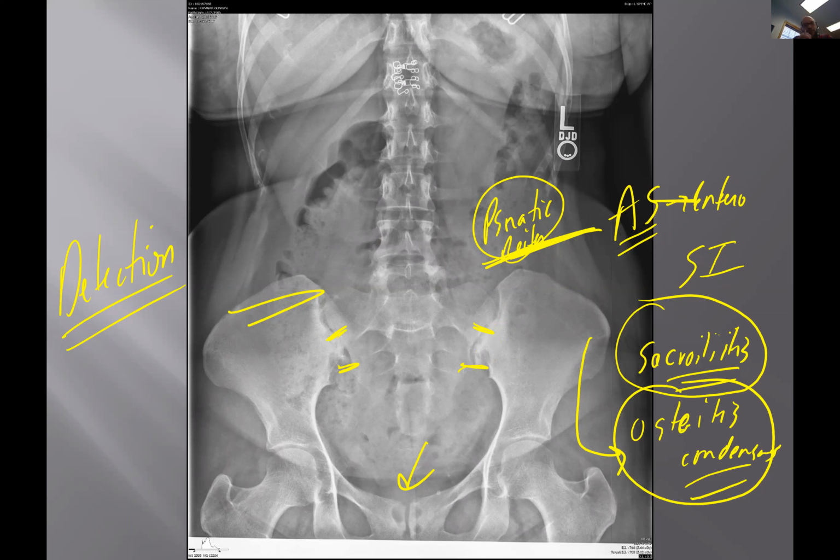And so that's where you're going to get your micromotion and your abnormal biomechanical loading on the joint itself, which is going to give you stress-related movement changes. So you're going to see the sclerosis in all 3 compartments, upper, middle, and lower, because the lower has the joint and moves, which causes Wolff's Law, that yes, the middle and upper bear the brunt of the load. Does that make sense? Sure does.